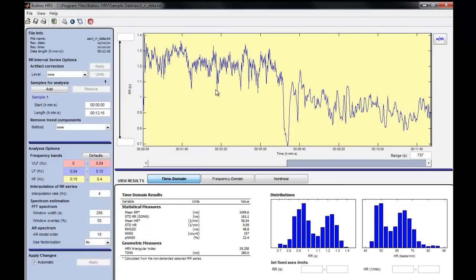Now the first thing we're going to get is this mess of data. We'll go through it piece by piece, but before we do that, I want to say a little thing about HRV analysis. The whole purpose of this lab was to examine how heart rate variability, HRV, is modified in overtraining. Problem is, we don't have data from overtrained athletes that we can break down and analyze ourselves. We just have tables in different studies. The good thing is that the HRV profile changes in overtraining the same way as it changes in increasing levels of physical activity. So we can look at increased physical activity, see how the HRV changes, and extrapolate over to overtrained subjects and expect to see the same changes in those subjects.